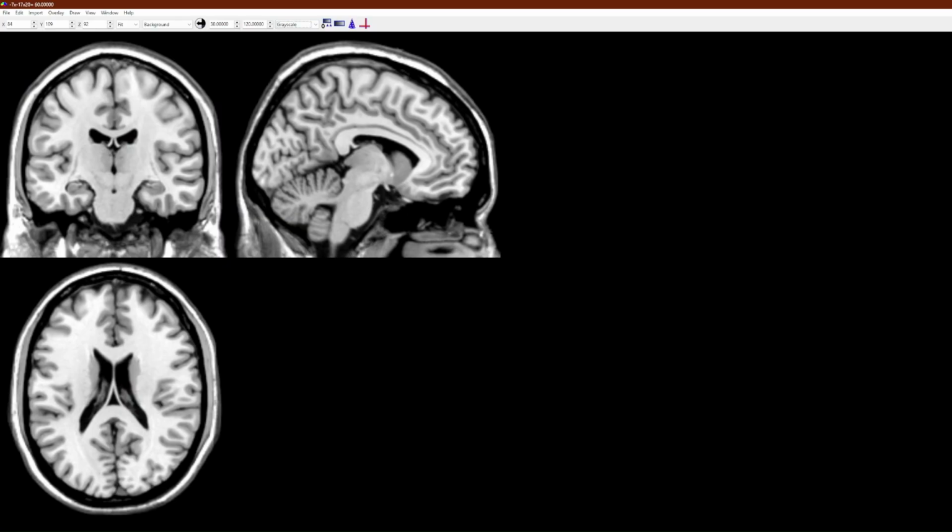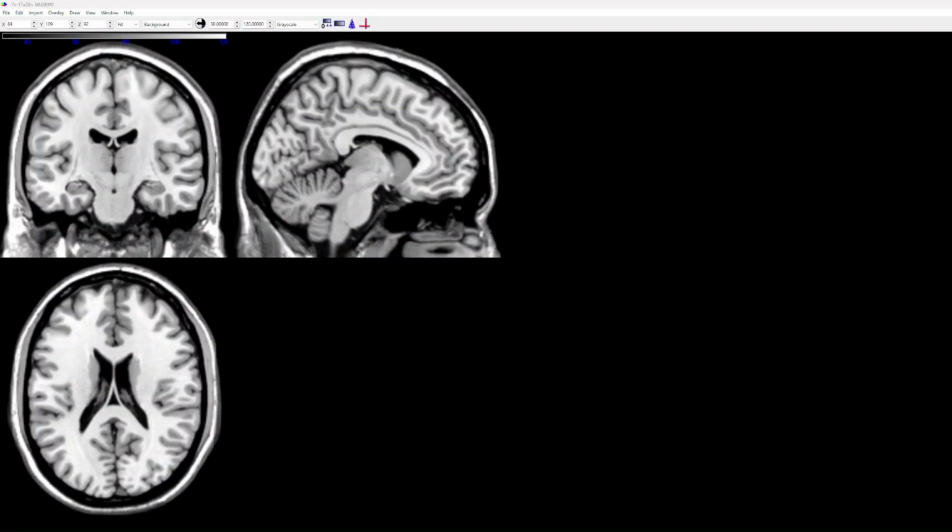You can also see there's some controls here where you can change the intensity of your color maps. So your T statistic threshold, transparency as well. You can change the transparency. You can see the scale at which you're working with your heat map, and you can also see the visibility of your selected layers. So one of the major benefits of MRIcron is your ability to do multiple layers.